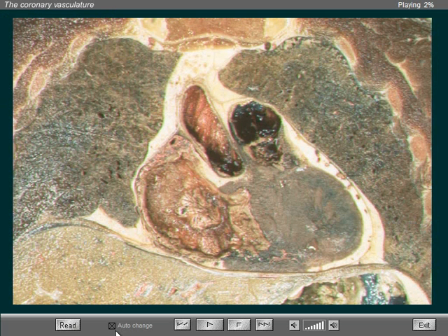The pericardium is an envelope which surrounds the heart. In a normal individual it contains a very small amount of fluid, and actually the pericardial cavity is not visible radiographically unless there is separation of the visceral from the parietal pericardium.